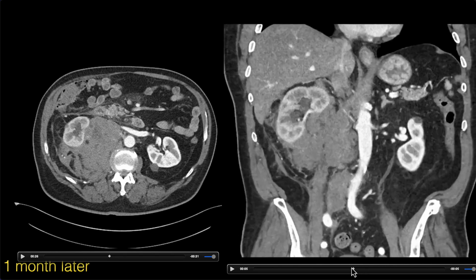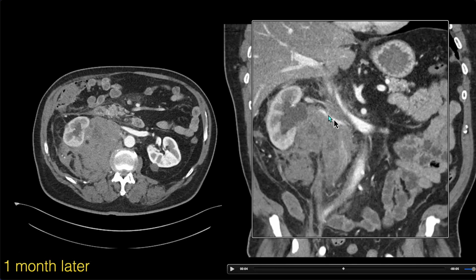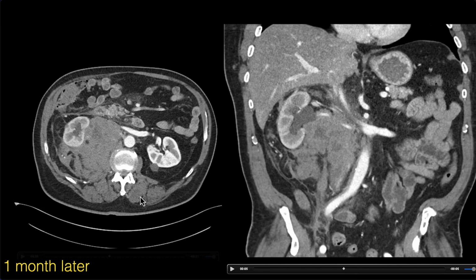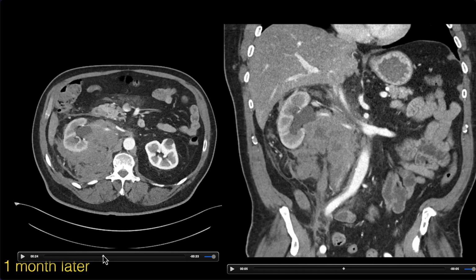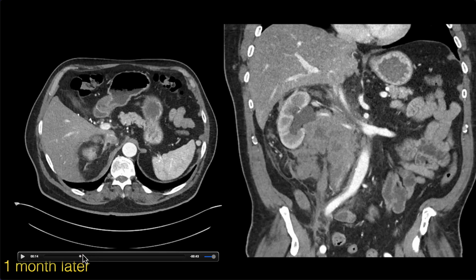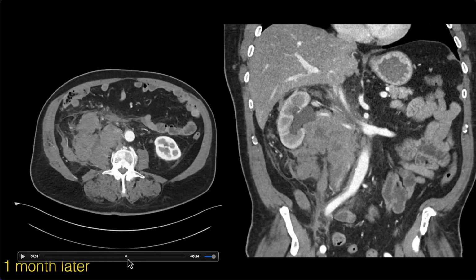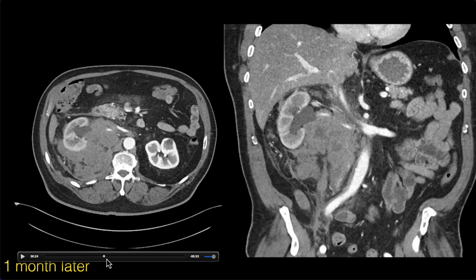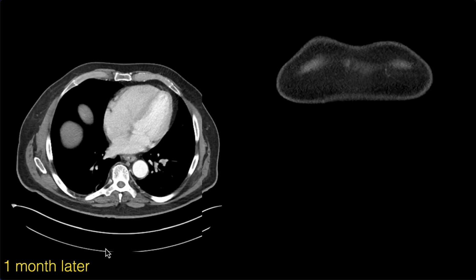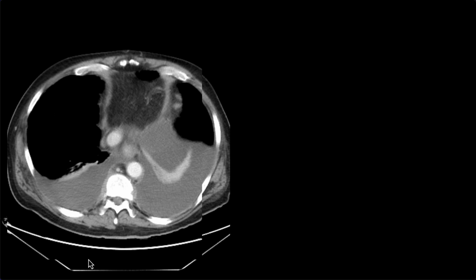And so if you're seeing an infiltrative soft tissue mass, notice how it's surrounding some of the vasculature, how there's not only what you could think of as a primary component of the mass here, but these other separate areas within the retroperitoneum. We don't have nodal disease as a primary feature to help us, but certainly if there's a high suspicion of renal lymphoma based on these findings, just realize the importance of making that diagnosis on a timely basis and how quickly these patients can progress.